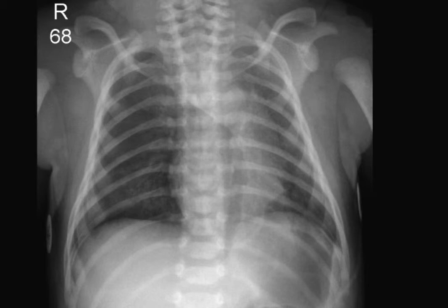The only evidence here is that the posterior recess is much better seen, more lucent than the opposite side, and you have this line here that you need to explain, which is herniation of mediastinal pleura across the midline. So this is another example of unilateral hyperlucent lung. However, in this case, you can see evidence of a pneumothorax by the lucency of the posterior recess and the herniation of mediastinal pleura across the midline.